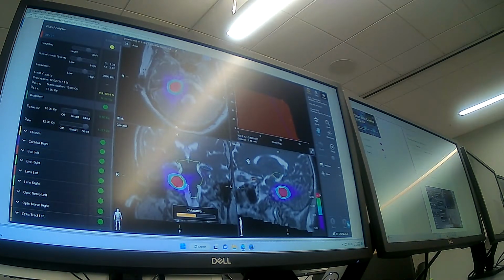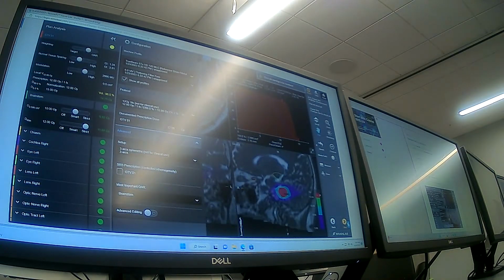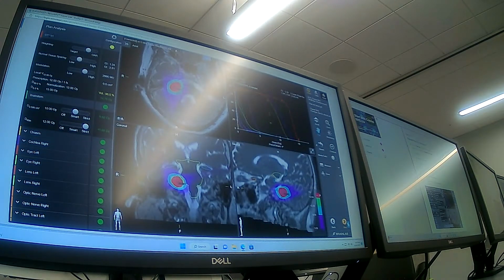It has a role PTV. You can't treat it without the PTV. You already got the decision model, I see. Yeah, I had 2 GTVs. It gets upset. There's a way to trick it on that one.